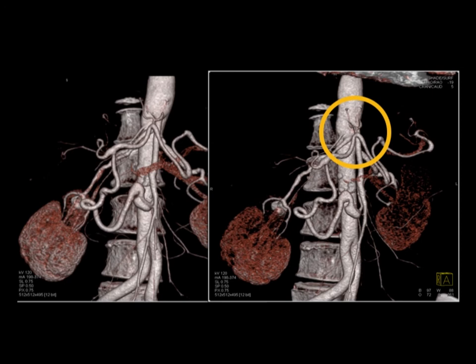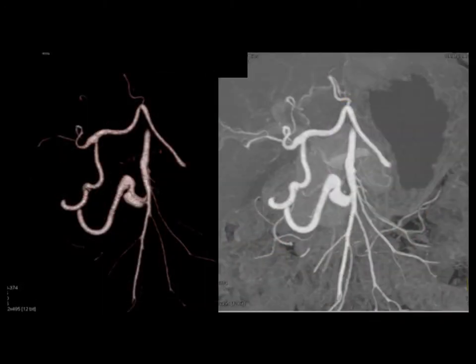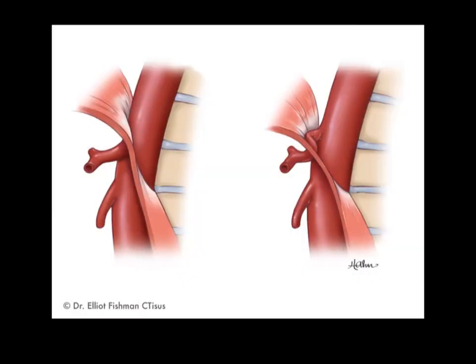And so if this patient would get a Whipple's procedure where you sacrifice the GDA, or get hepatic surgery, and the GDA is resected, you could see the disaster. There's no flow to the hepatic artery then, and the patient could infarct the liver. And here's just a nice example of that narrowing. So it's something to be aware of, and here's just a very nice set of pictures.